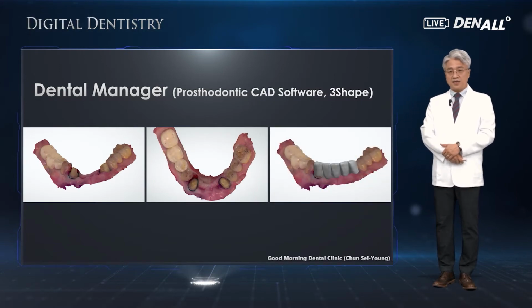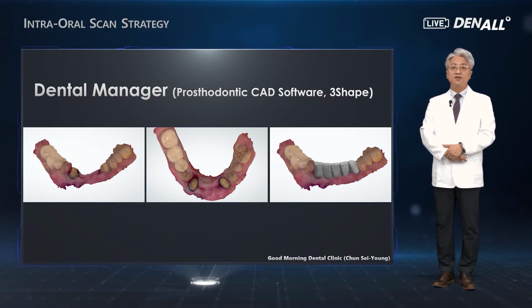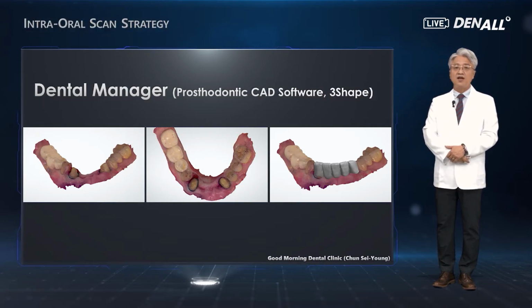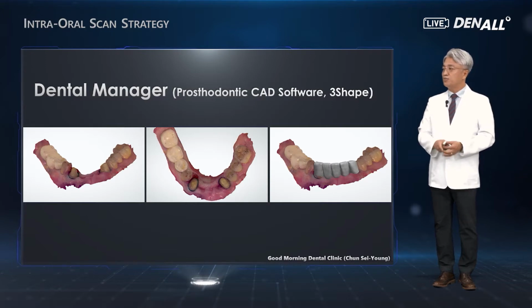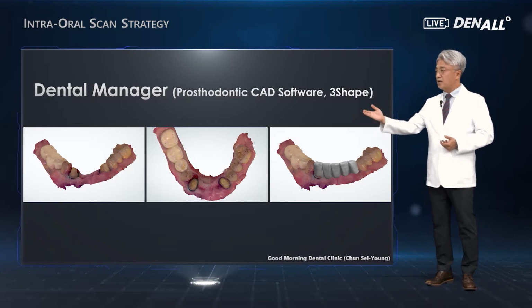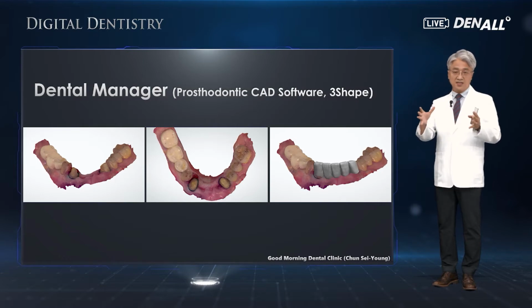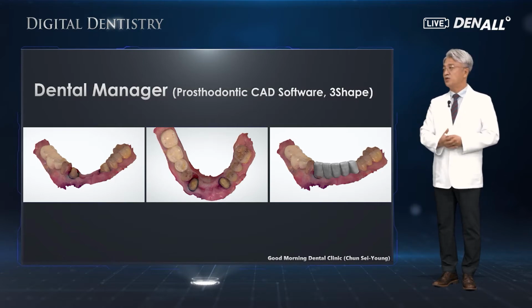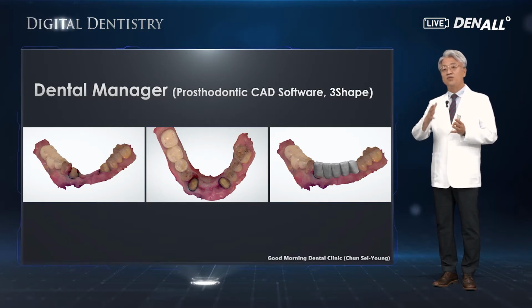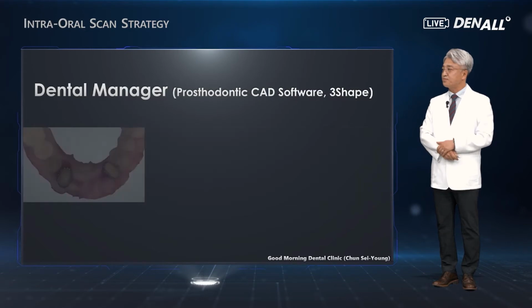Now, the digital model acquired from an oral scanner is moved to the 3Shape Dental Manager software for prosthesis. As you can see, the margin, crown, and gingiva teeth have very wonderful natural colors. The positions and volume are very precise, so we can fabricate the prosthesis model-less by designing them here. It can be delivered to the patient with a satisfying outcome.